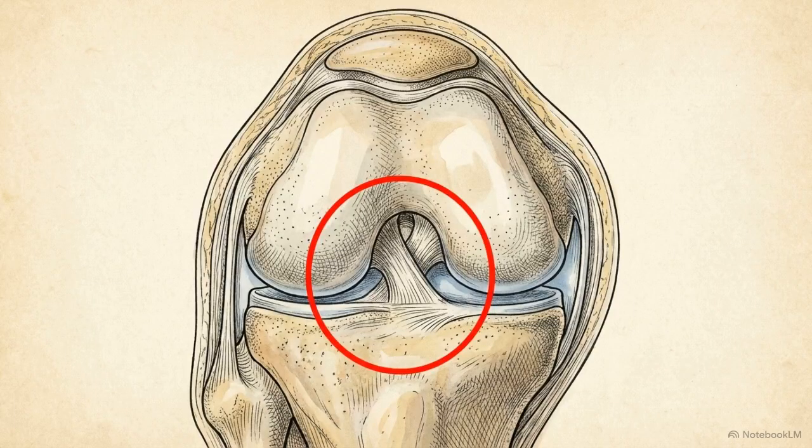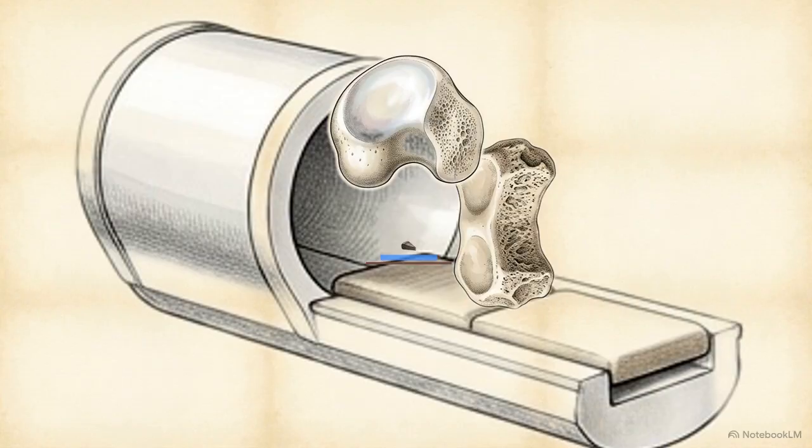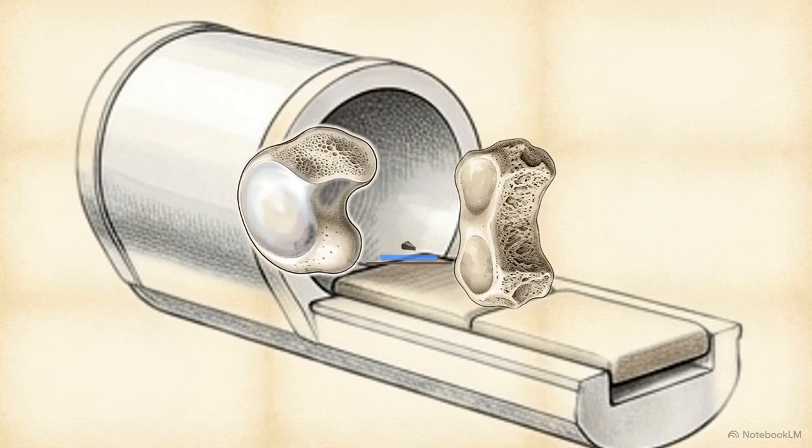When looking for these lesions on MRI, identifying fluid-like signals separating the meniscus and capsule is the most specific finding we have, reaching up to 98% specificity. Yet it is the least sensitive, frequently dropping below 50%. The low sensitivity is a direct result of patient positioning. Standard clinical MRI knee coils require the patient's leg to be placed in full or near full locked extension.